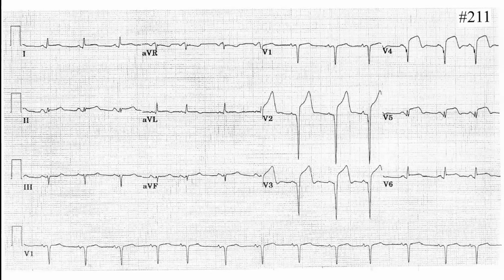Okay, your turn. So this is rhythmic. Can you hear me?